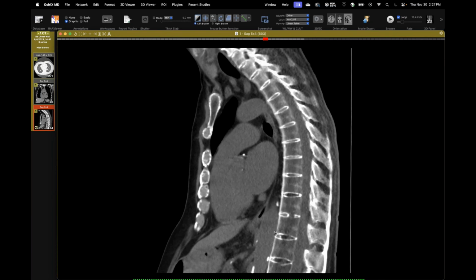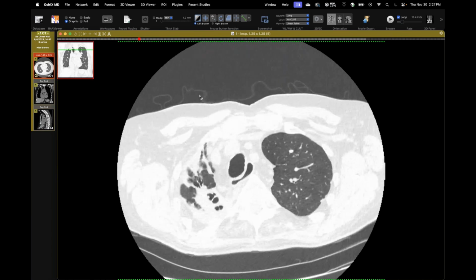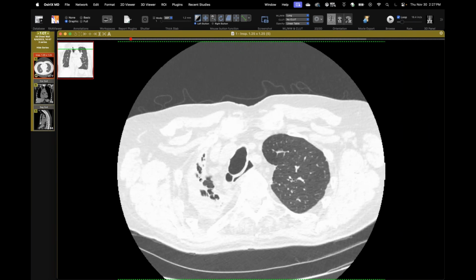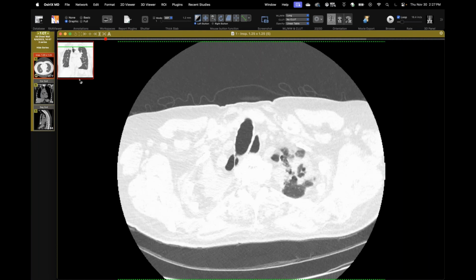So known ankylosing spondylitis. And the reason I came across this was an ILD consult, is this patient has this upper lobe fibrosis with traction bronchiectasis. It's very dense. There's a little bit less on the other side. Let me show the coronals.